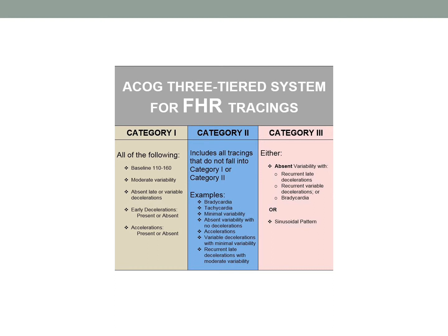Or a flat line with late decelerations. Flat line, and every time the patient has a contraction, she has a late. Another contraction, a late. Another contraction, a late. That would be a category 3, which means we have to get this baby delivered stat, okay? The other finding that makes it a category 3, and we're going to look at some pictures, is a sinusoidal pattern. This is that undulating, serpentine-looking pattern that is indicative of fetal distress, okay? And this is an ominous finding. We do not want to see it, and if we do, we want to make sure that we can get this baby delivered ASAP.